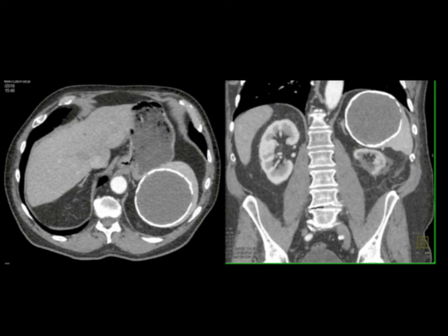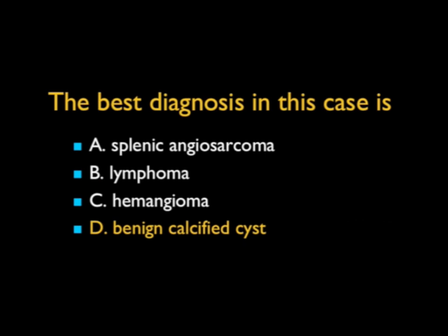No problem. There's a great article in Radiology this month, and this month being April 2018, which basically says an incidental splenic lesion with no known malignancy or no clinical symptoms is essentially always benign. They had 2 cases with malignancy, but there were other findings, including in the liver. So incidental splenic lesion with no clinical history is always going to be benign. So that kind of makes you feel better, perhaps, but this is, again, a benign cyst.